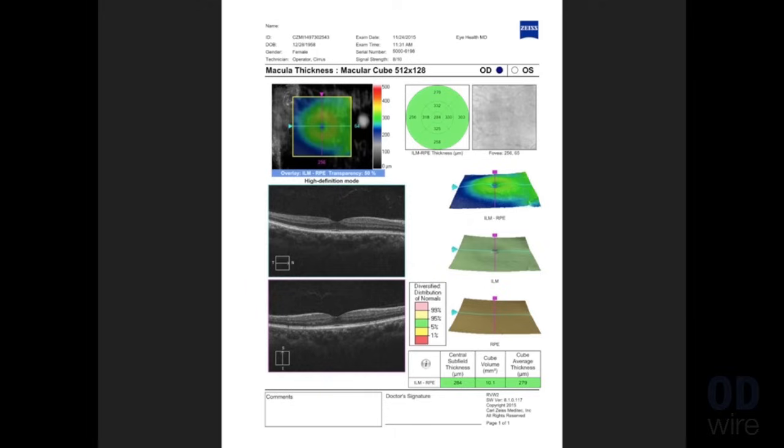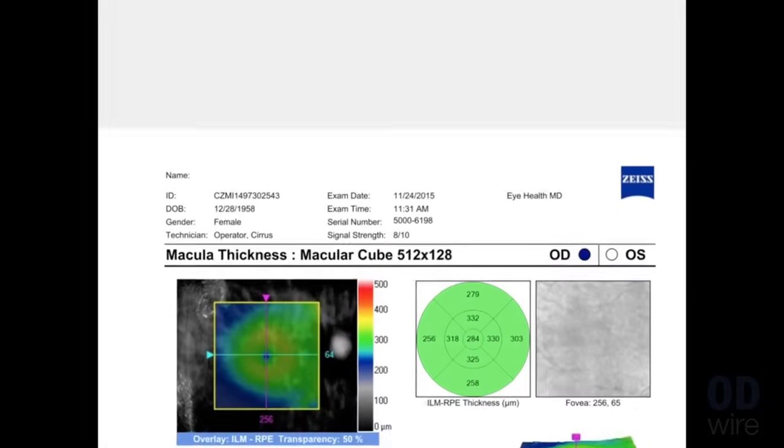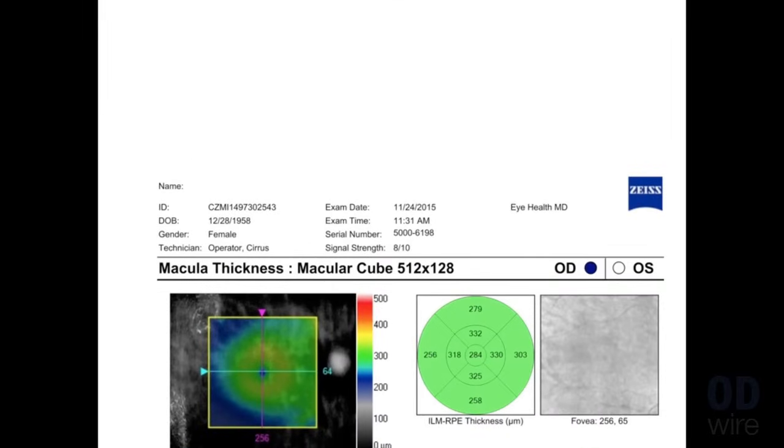Of course, there's a great deal more parts and more information on this sheet, and I'd like to go through a few of those with you. As we zoom into the topmost section, what you'll notice principally is that there's a lot of identifying data. Perhaps one area that gains a lot of attention is signal strength. That gains a lot of attention in the area of glaucoma scanning, where it's very important. However, in macular OCT scanning, that's not quite as important, and you can actually do a lot even with a lower signal strength. But again, you've got your identifying data up top.